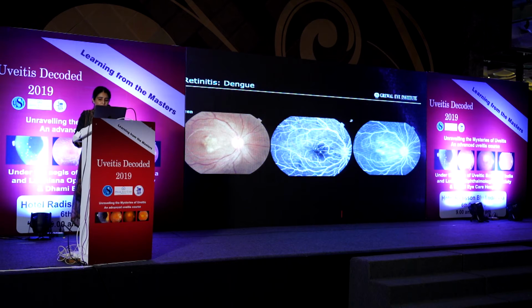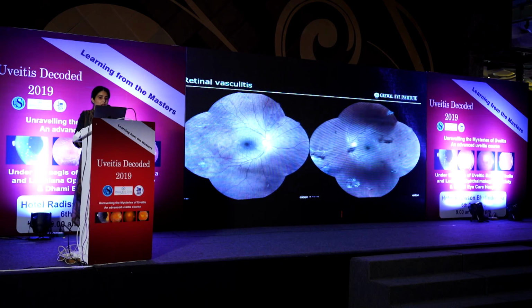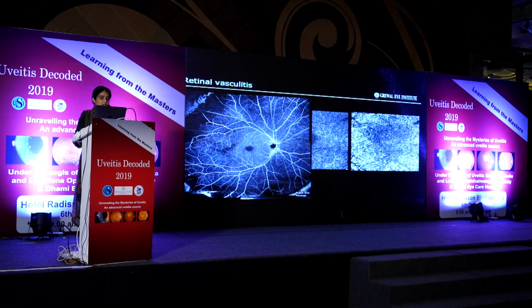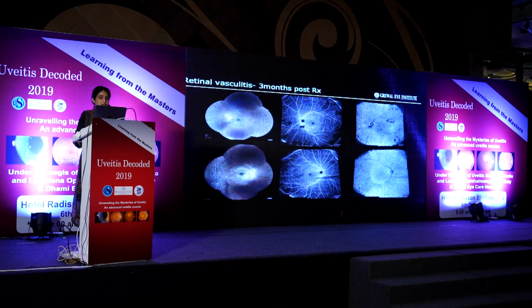This is a case of dengue maculopathy. Again, retinal infarction is picked up nicely on the deep capillary plexus slab of OCT angio. Now moving on to the vasculitis, it's a 28-year-old with bilateral peripheral vasculitis. FFA shows CNPs and NVE fronds, as the 6 mm OCT angio will not give you much information qualitatively, and wider OCT angio depicts these areas of non-perfusion. And also monitoring becomes a little easy, as you can see your PRP scars and also pick up any new area of non-perfusion or NVE which might develop in the future in a non-invasive manner.